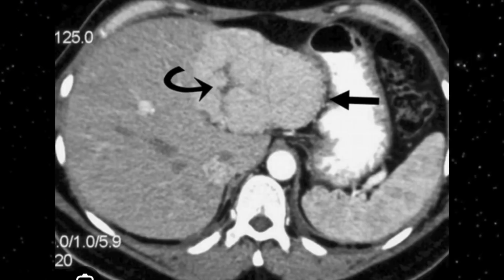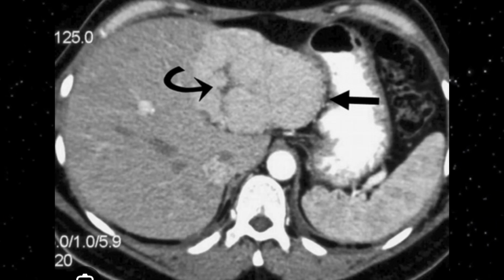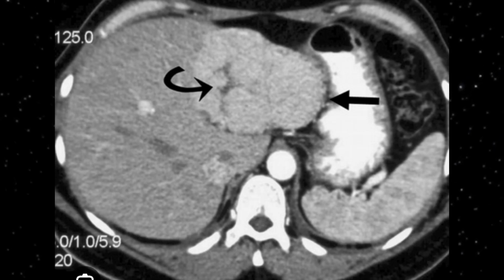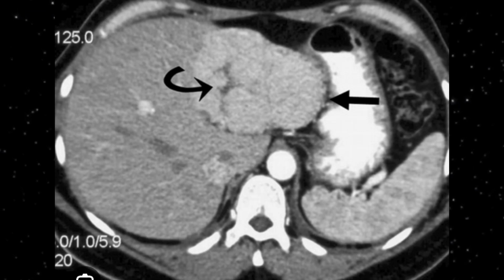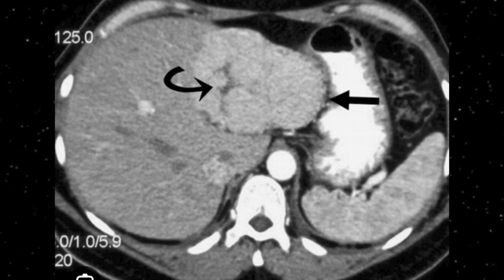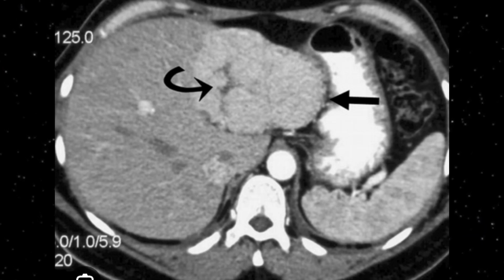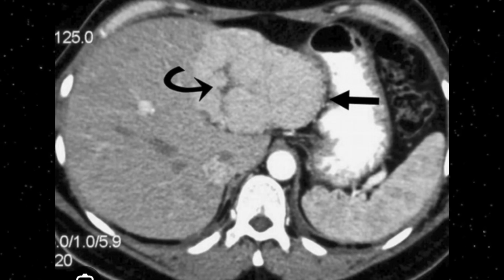So this is another example of focal nodular hyperplasia which required attention for the diagnosis. Another classical example on contrast enhanced CT. Here you can appreciate the liver appears normal. These are axial images of the contrast enhanced CT. The liver shows normal uptake, while the lesion, this focal nodular hyperplasia, shows contrast uptake with a central well-defined hypodense scarring.